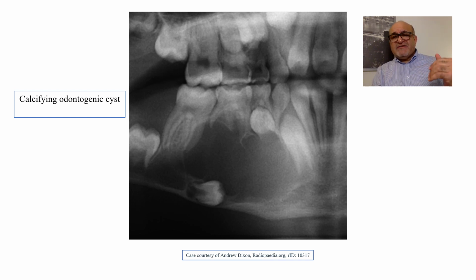The lesion is mostly seen in canines, and you can also see it in the premolars as well. The maxilla and the mandible are again affected at almost the same rate in this area, as the lower mandible and the upper maxilla are the most common places where you can find these lesions. However, they may go back posteriorly to the premolar area.